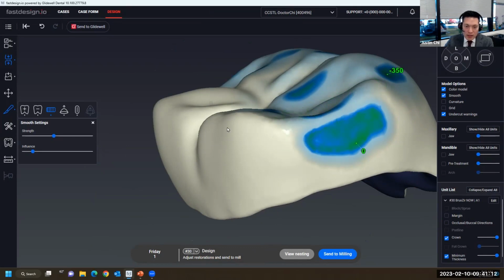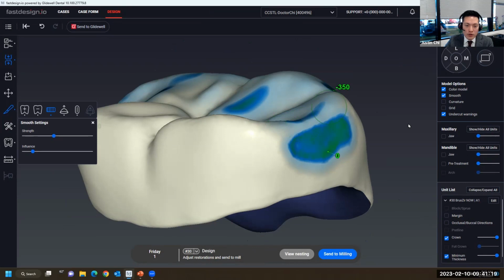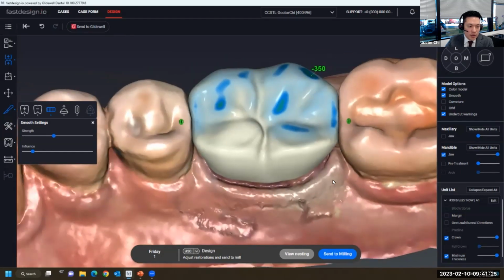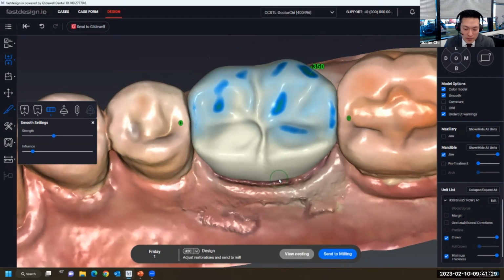These openings also allow for the passage of food to the buccal and lingual while the patient is chewing. So this will also lead to a more open space where it's easier for you to pass floss through during the cleaning of the cement, and also for your patient to clean those zones during their regular hygiene. Hopefully they are flossing.